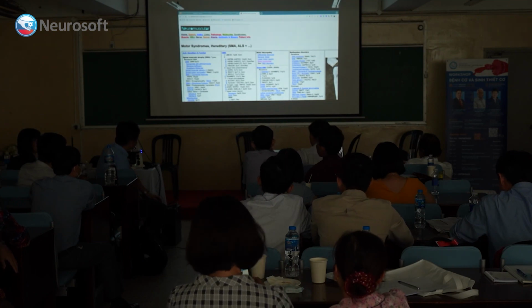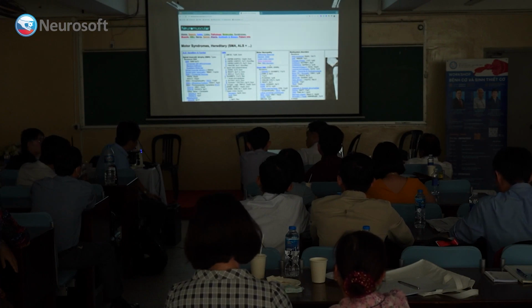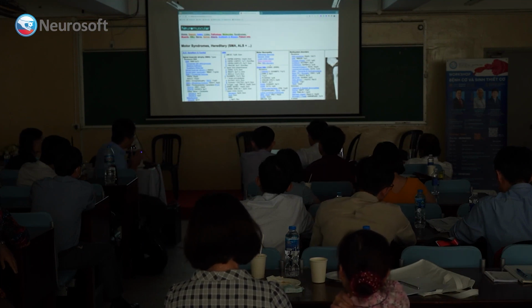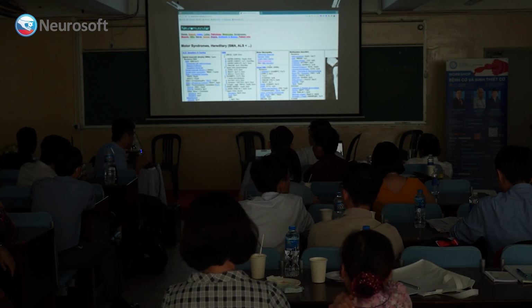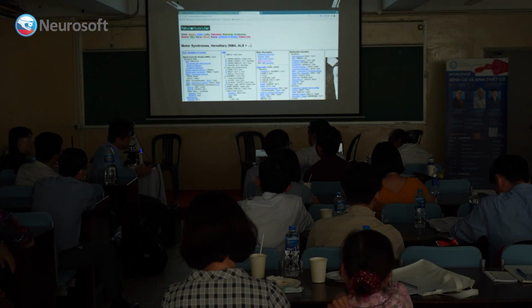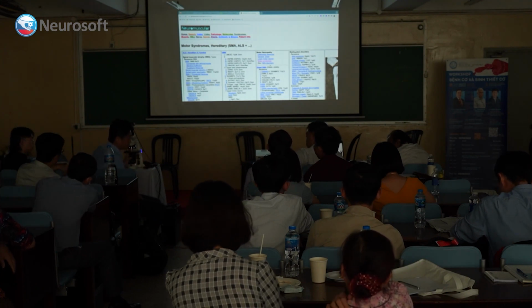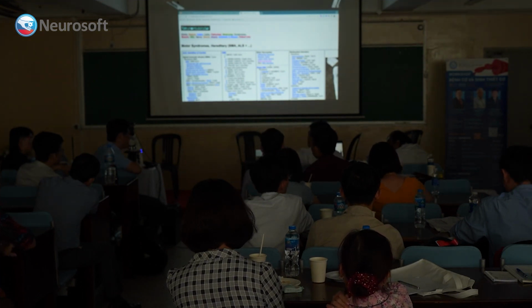And another one, I'm not sure if this is a myopathy or whatever. Certain gene mutations like DNAJB6, DNAJB4 actually cause a myopathy very similar to rimmed vacuolar myopathy, but the rimmed vacuoles may not be so obvious as compared with GNE myopathy. So in that type of myopathy, I think maybe like this, but I'm not very sure. Again, this is inconclusive, so I think you have to cast a wider net. Yes. And I would do whole exome sequencing.